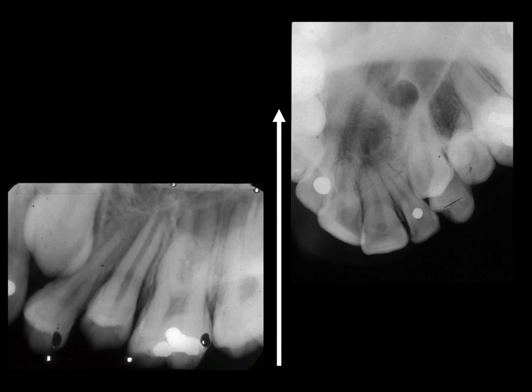Parallax does not have to be done in a horizontal direction. It can be done in any direction shift. And here we show the same example, the same canine tooth with the posterior periapical here, but in this case accompanied by an occlusal radiograph. Now think to how we take occlusal radiographs. These are taken with a fairly profound downward angulation, probably about 55 degrees in this situation. Look at what the crown of the canine tooth has done relative to the incisor and the first premolar.